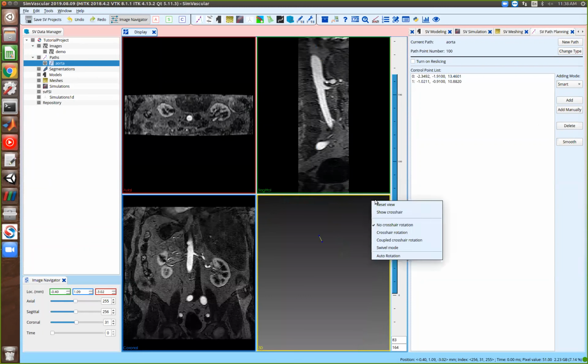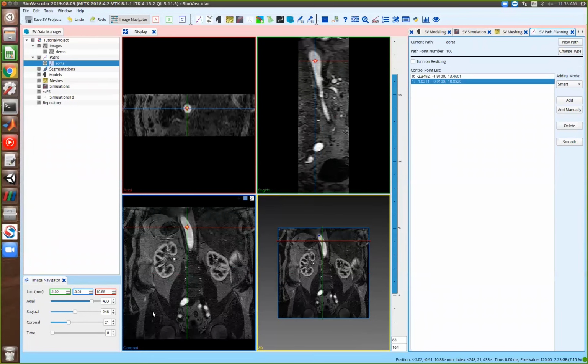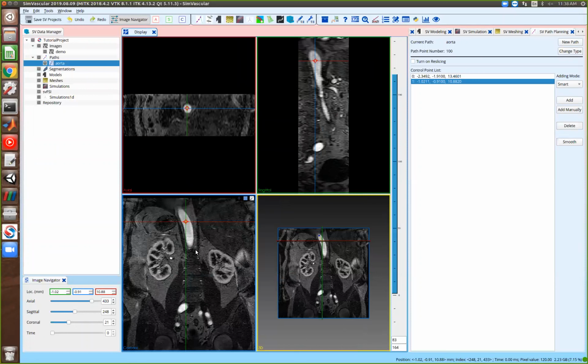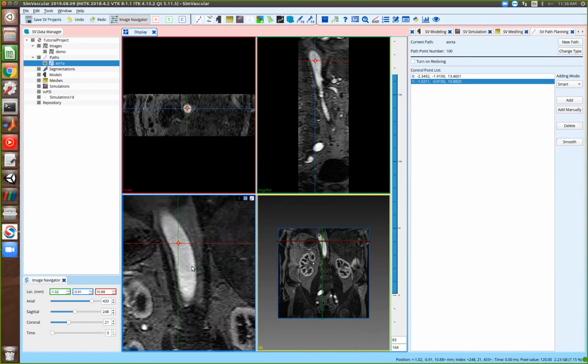So I'm just going to show that again. Now I'm all off, so I accidentally clicked outside and I'm just completely uncentered. If you want a shortcut to getting back to where you were modeling, just go up to where that point is and click on it, and it will bring you back to that point. I'm going to right click and drag to zoom in, and then click my scroll wheel to pan.